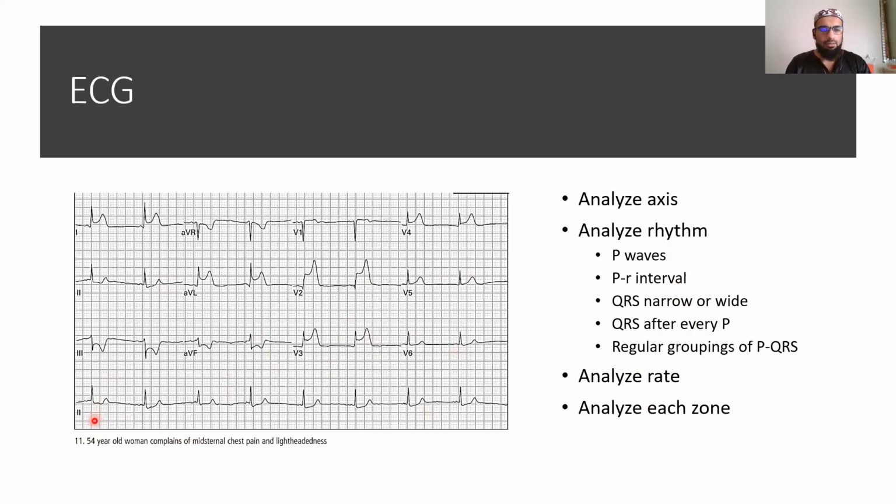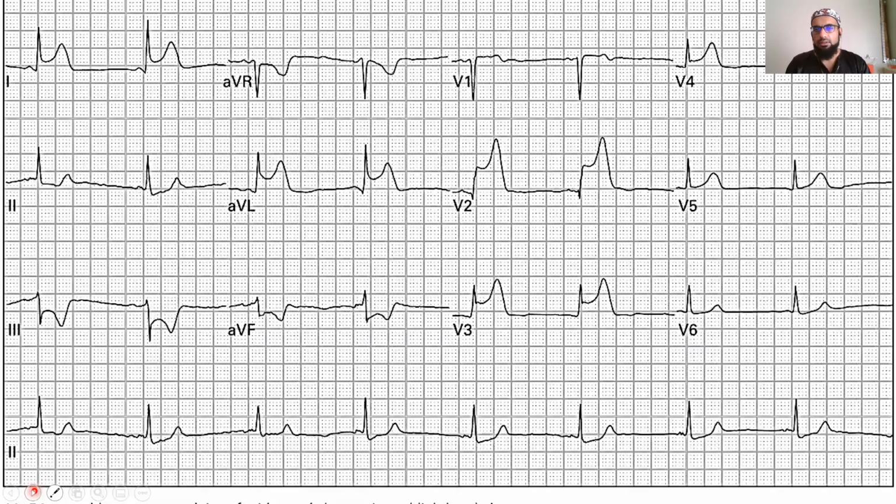And those of you who have some experience with ECGs should already be seeing something, but we're going to do it in a step-by-step fashion. My apologies, my voice is not too good. My throat is just troubling me a little bit, but I'll try as best I can.